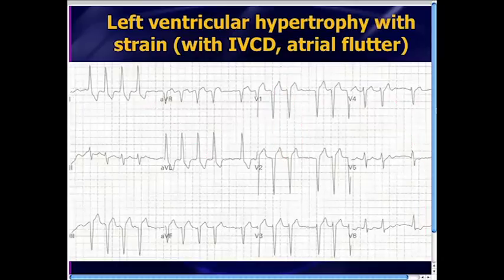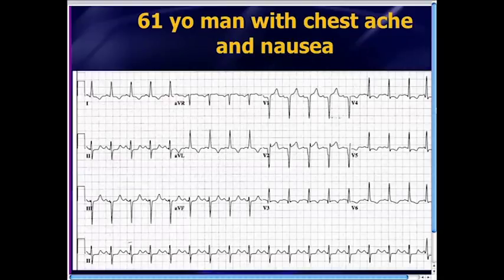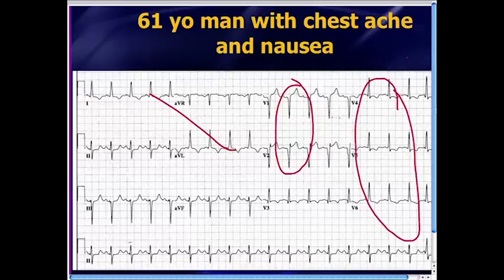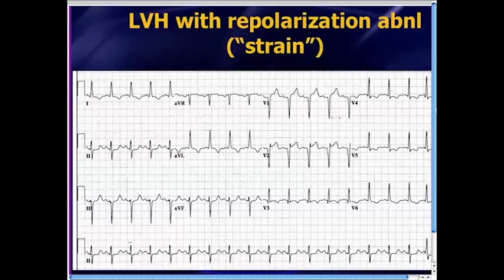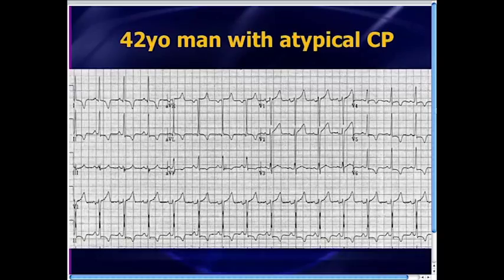Here's another 12 lead. And this actually resulted in activation of the cath lab, which turned out to be a false positive cath, clean coronaries. But it looks like there's a septal STEMI. There's some flipped T waves and ST depression out laterally. So it would be very easy to call this a septal STEMI with lateral reciprocal changes. This turned out to be purely LVH with strain. When in doubt, don't hesitate to call cardiology with these type of cases. All right. So this is a really difficult diagnosis to make. There should be no doubt about that.